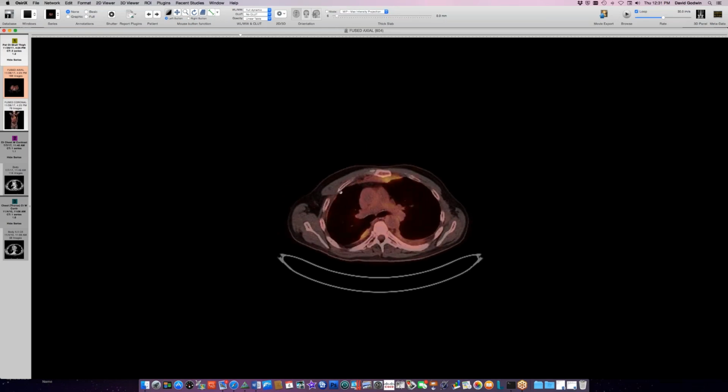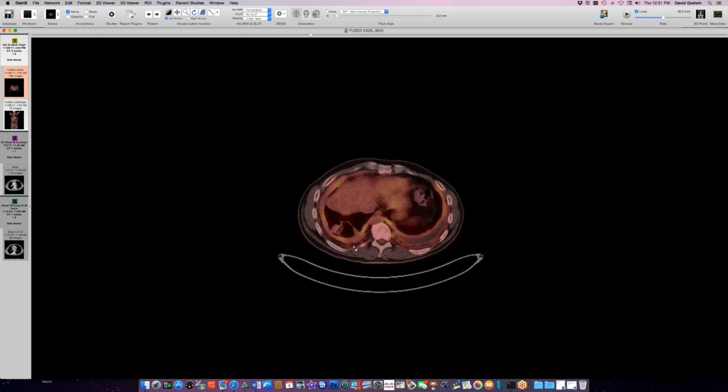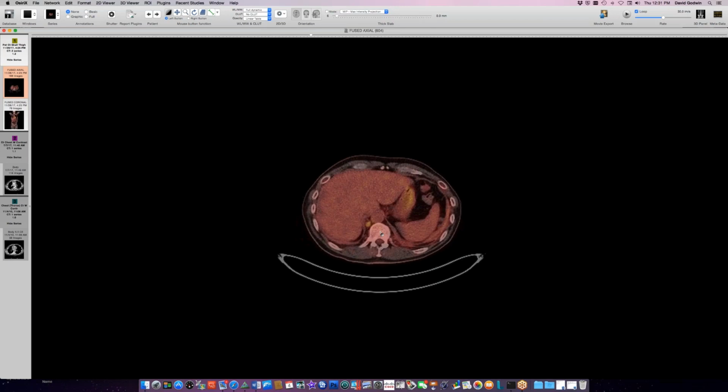And here's a PET scan showing some moderate uptake in that anterior mediastinal fat. There was fibrous tissue and this plasmacytic infiltration. It was polyclonal, so it's not considered to be a plasma cell tumor. And you can see the pleural uptake, modest pleural uptake on both sides too.